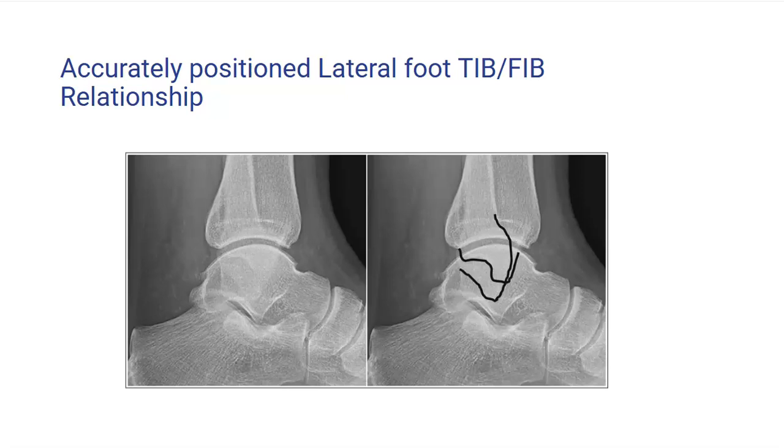If one talar dome appears more proximal than the other, assess the medial arch height, fibula tibia superimposition, and talocalcaneal joint to determine how to readjust the leg for proper alignment.